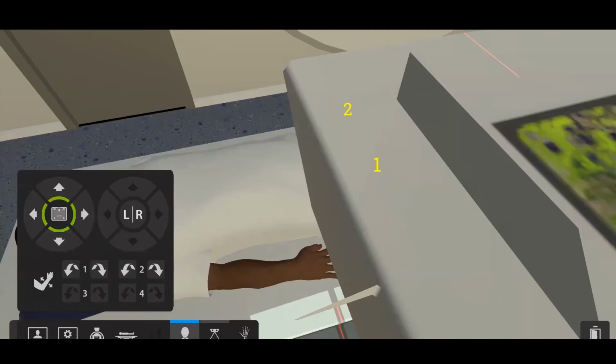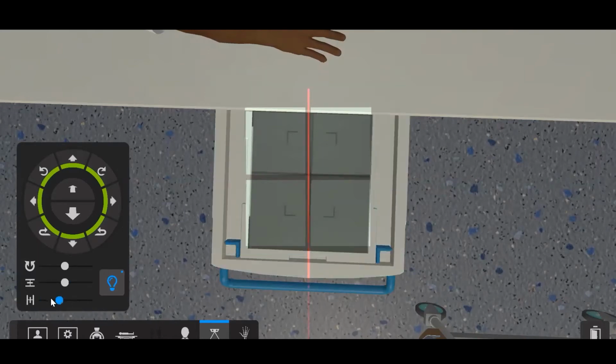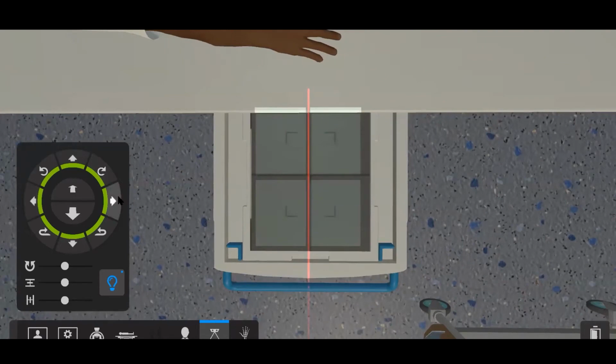All those green lights mean, and actually what you can see, this thing here is just looking down over the side of the tube. If I was to move the tube out of the way, which I will in a minute, you wouldn't see that. I can then collimate the cassette in the Bucky there. Straighten that up a little bit.